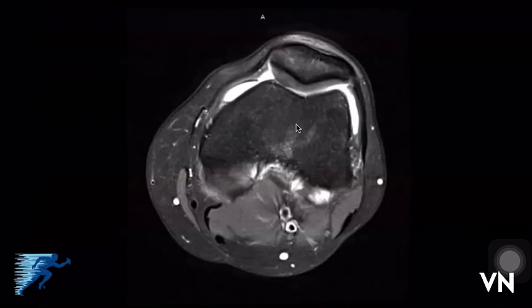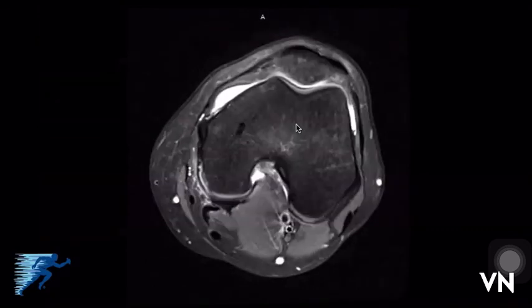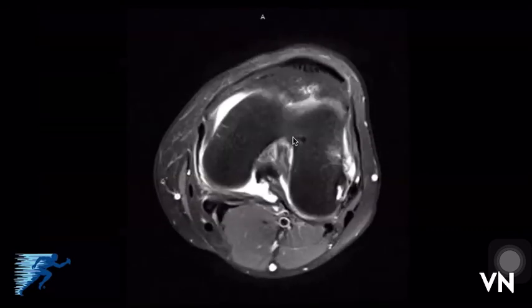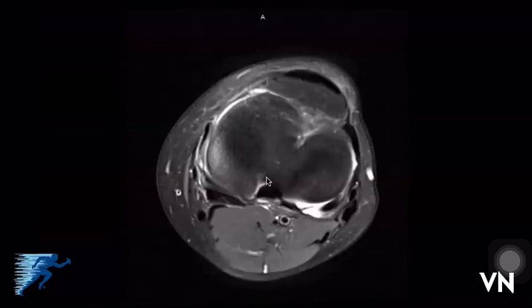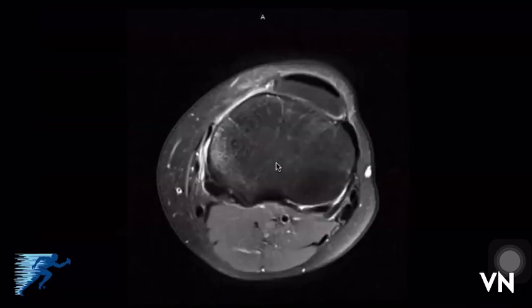As we get closer down to the joint line, we'll see a little bit of signal intensity change within the meniscus, but it's really difficult to see. Here's the posterior horn of the medial meniscus. We could see some substance change within it there, but it's not as clear and defined as we can see on the sagittal views and also on the coronal views when we're looking at an axial cut and trying to assess the amount of tearing that may be present with a horizontal cleavage tear.